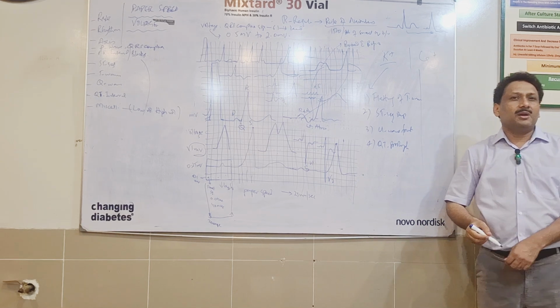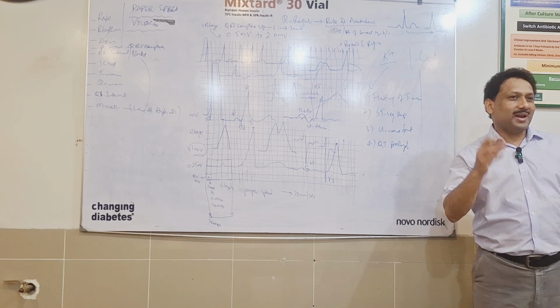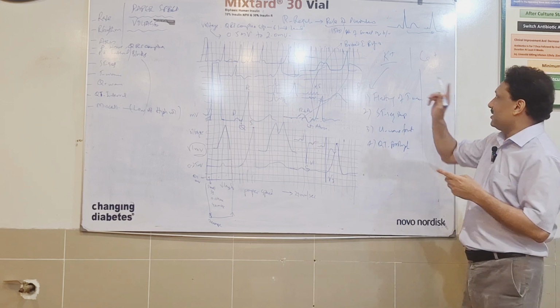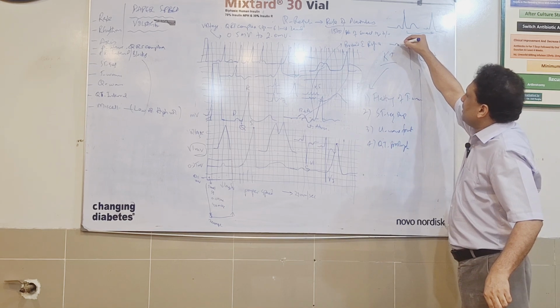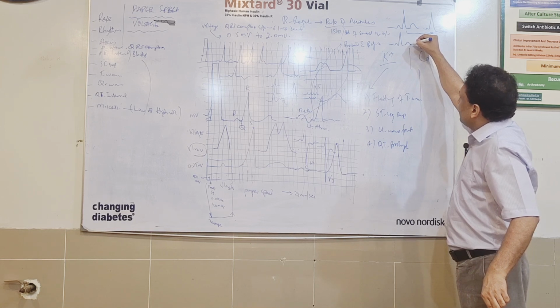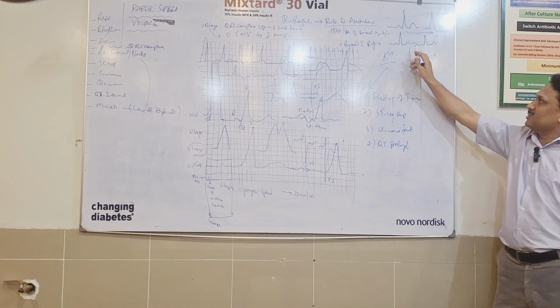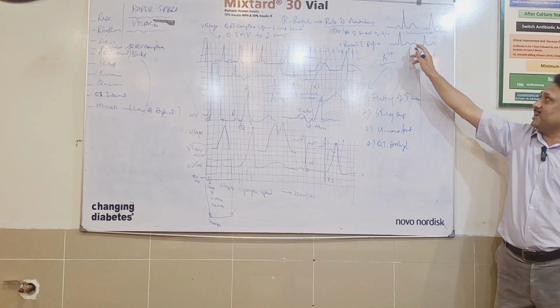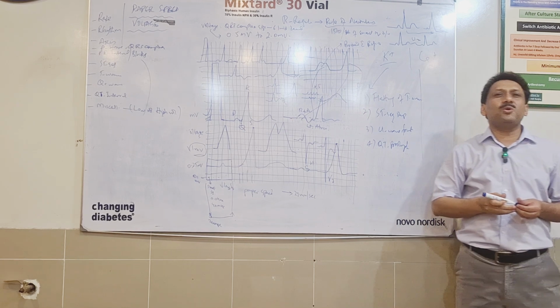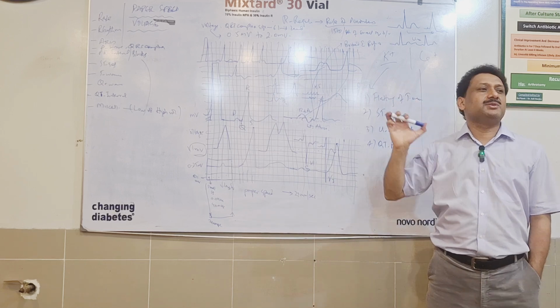What is U wave? A U wave is another T wave. Its name is U wave. You can have a kind of wrong concept that a U would be there, but remember, this is not U, this is another T. QRS complex, P wave, QRS complex, T wave, another T wave, and then P wave, QRS complex, T wave. So there are two T waves here. The second one is known as U wave in the setting of hypokalemia, and in many other conditions you can have these U waves.